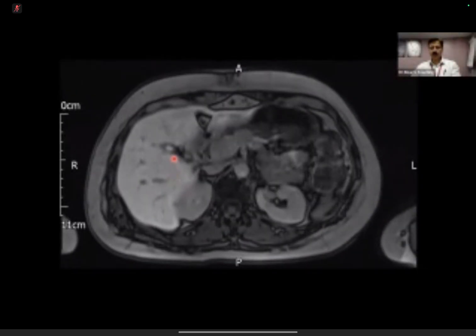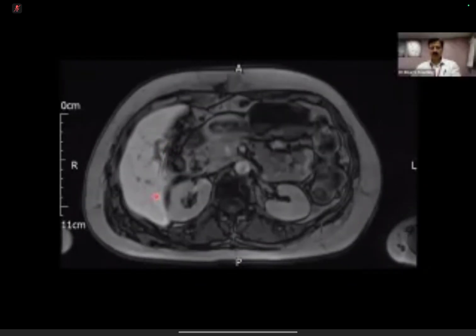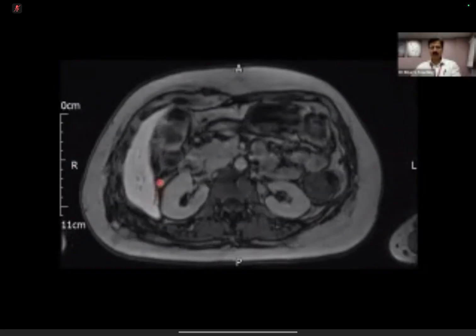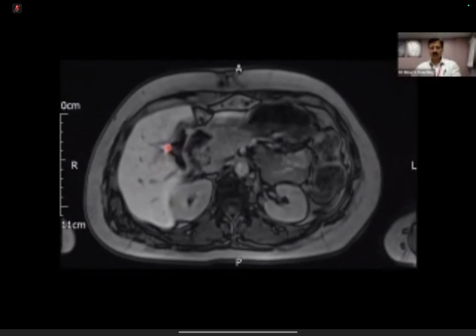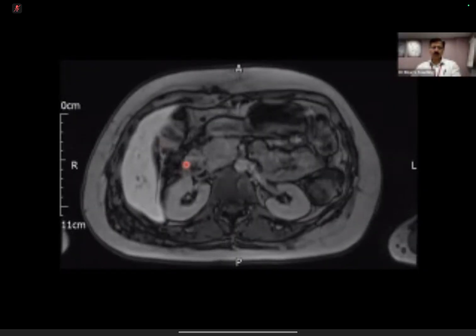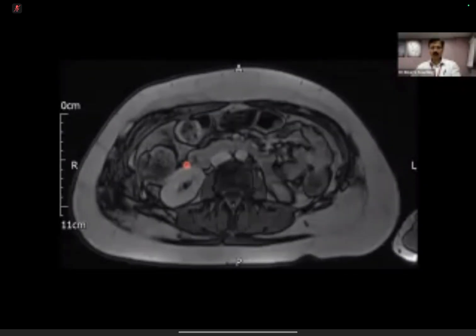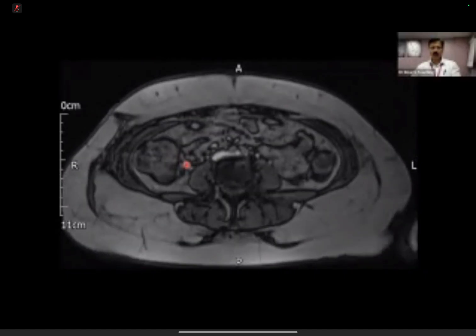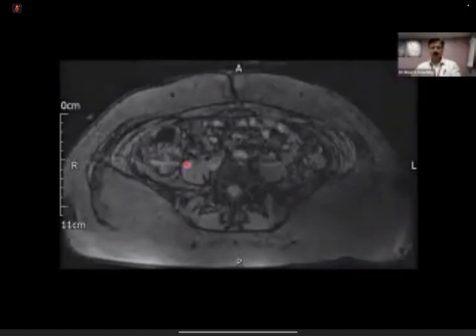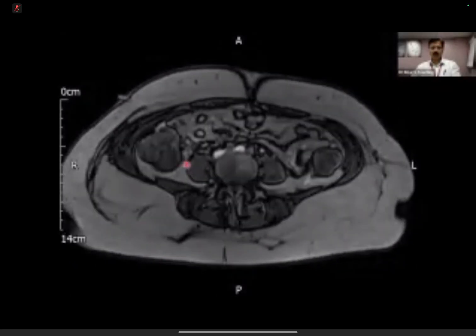On this 20-minute image, within that gallbladder fossa, you can see something there, and this is what we call the drain. You think, oh, something is leaking into this. So what you do is you do a further delay, and this is a 60-minute delay. Administratively speaking, it's a big ask. Either the patient has to be on the table, or if not, you can scan somebody else and then bring the patient in.